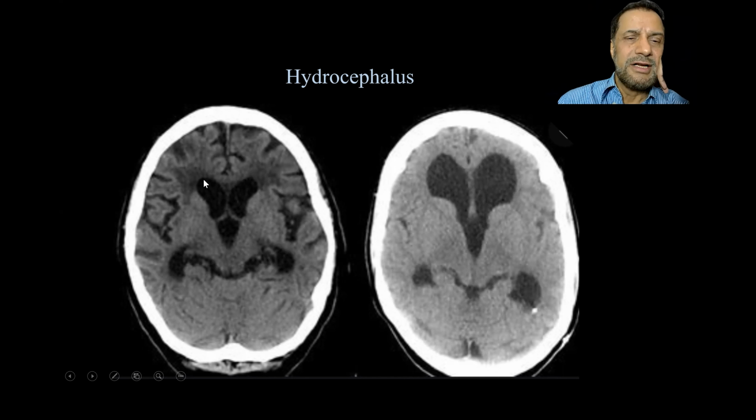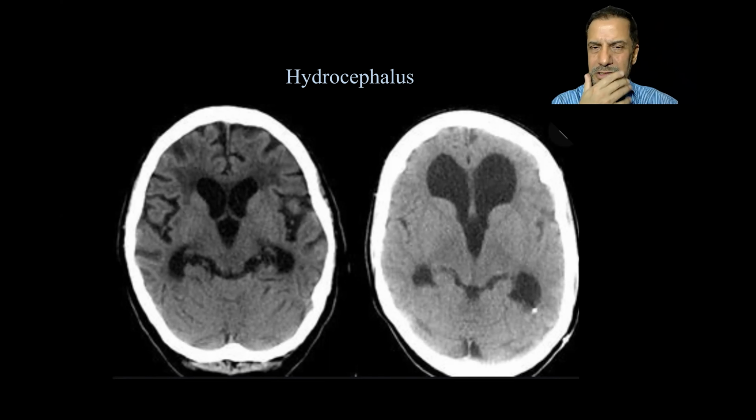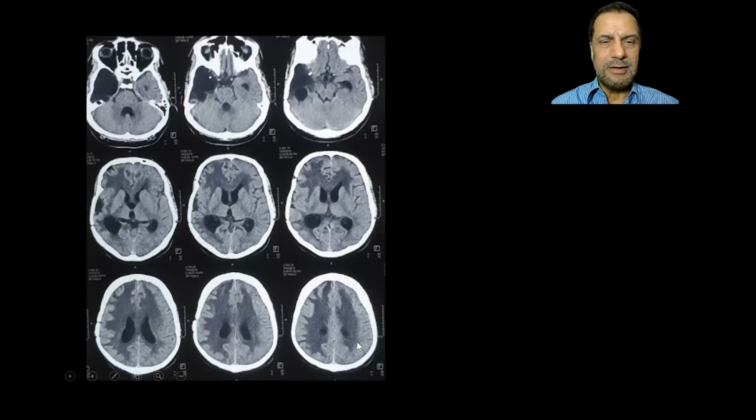of the ventricles. Then this means that there's a transependymal seepage of CSF into the parenchyma, so there's a lot of pressure there. So this says that there's a lot of pressure, but this looks almost like a compensated hydrocephalus. There's not much pressure here. So if the patient does not complain of much problem, then just for radiological sake, you don't need to treat these patients. But these patients will have a lot of ICP and they need treatment.